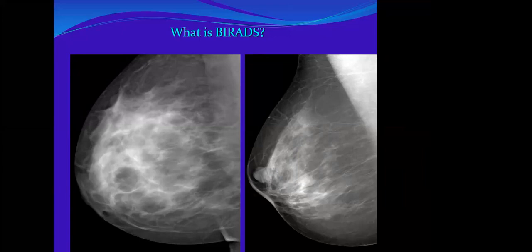the evolution of the breast tissue. The breast tissue is getting more involuted. The lesion is there. So, developing asymmetry. So yes, I'll say developing.